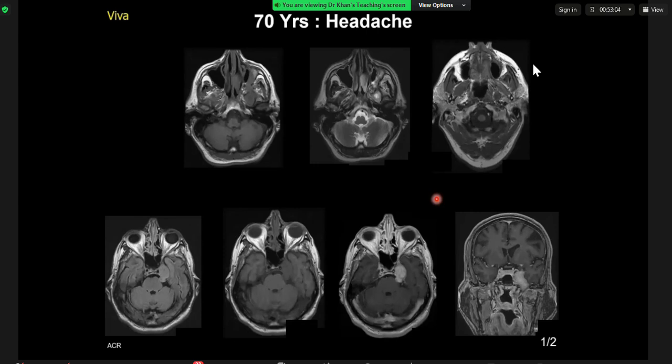So this mass lesion is enhancing on post-contrast imaging. T1 isointense, and it is slightly hyperintense on FLAIR. So there is contact with the left internal carotid artery laterally. I'm reviewing the suprasellar cistern to just make sure there is no involvement within that. Right now, I'm trying to see where this mass lesion is. Here.